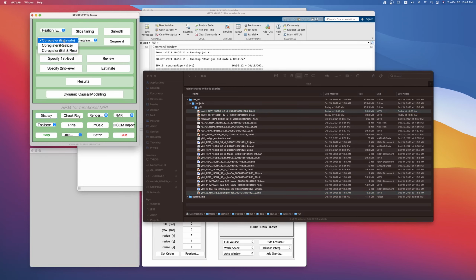And in this case, we don't really need to reslice or estimate and reslice. We just need to estimate, because we don't really need a new image. What we need is the header, which tells us how to read the image, and which will already instruct any NIfTI file reader to apply the geometry in the header when you open the file, so that you can read the data correctly in the right orientation.